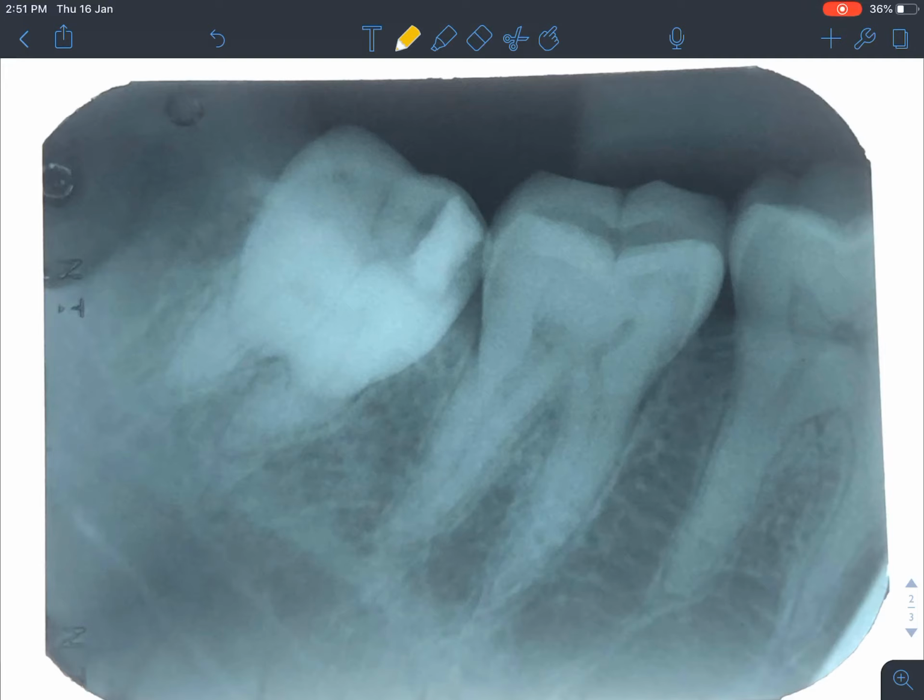Okay. Can we first define enamel, dentine, and pulp in the normal tooth? Yes. Can you show us? That's the enamel, that's the dentine, and that's the pulp. Okay, so can you draw out the DEJ? Okay, very good. The other side? So close?